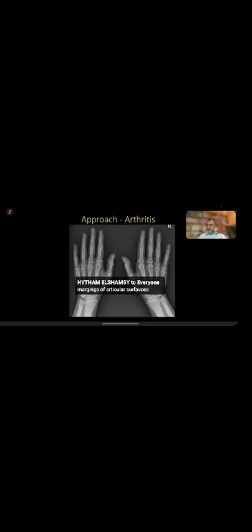Okay. But we have to have a system, a small system of looking at these things. We'll look at that in a minute. So we look at the distribution first. Okay. So overview. Go back, look at the X-ray. Just have an overview. Like we used to say, look at the bedside of the patient, look at the patient as a whole and see what's going on. So is there any abnormality? What is the distribution of that abnormality?